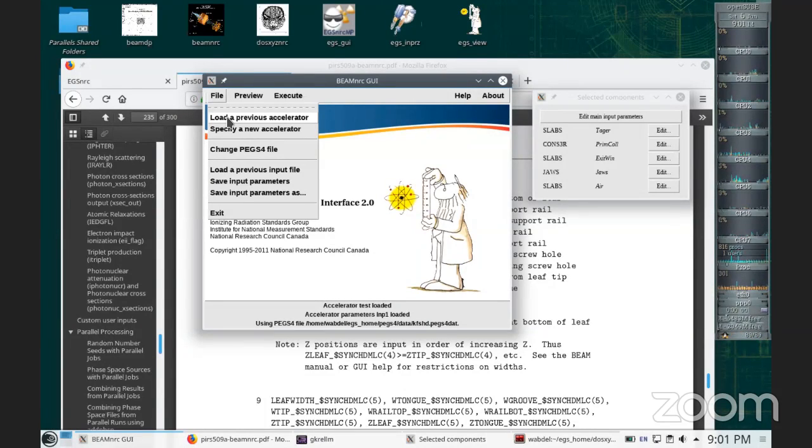Even if they give you that model of, let's say, a TrueBeam model or another linac or an electron machine, still the beam coming out from your linear accelerator might be a little bit different. That's why you still need to do some tweaking, change the energies, check those XYZ, do the profiles and so on. So we're going to spend some time on BEAMnrc. That's why I wanted to make sure you know those XYZ, those RZ, because this is the most interesting part.